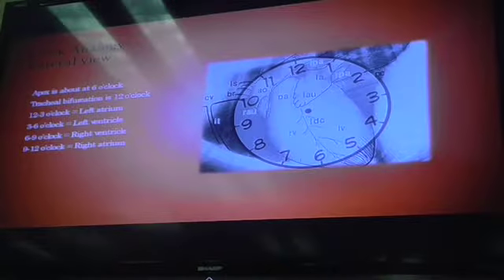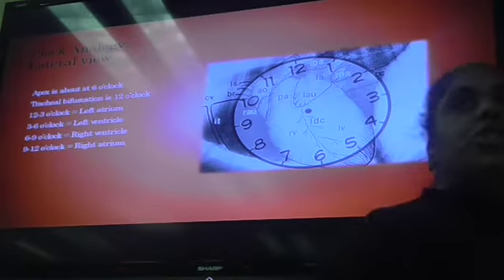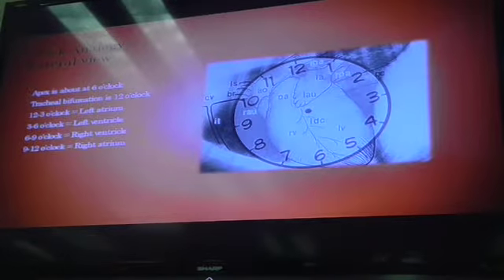The one that's not so commonly used is going to be the lateral view in regards to the clock. Right here, we're just really using it to kind of look at where our chambers are. Okay? So 12 to 3 is typically going to be that left atrium. 3 to 6 is left ventricle. 6 to 9 is right ventricle. 9 to 12 is right atrium. But on the lateral views, we have so much more that will help us really focus in on which side of the heart is enlarged.